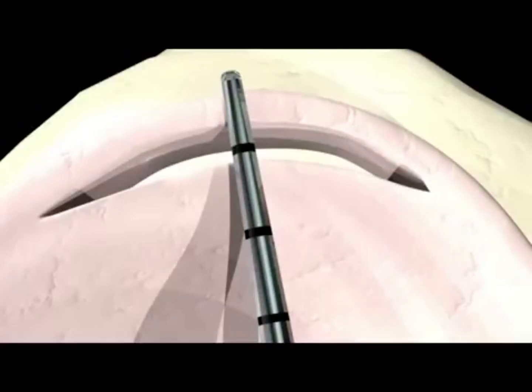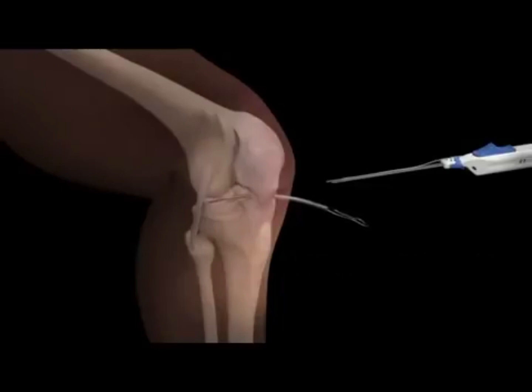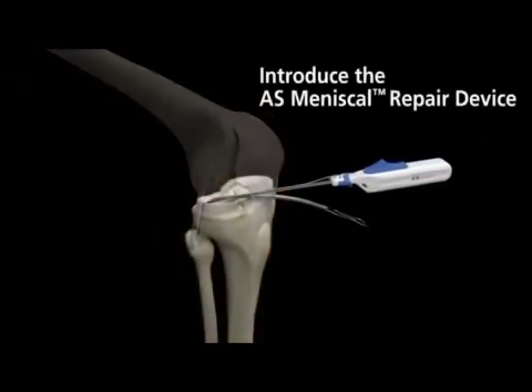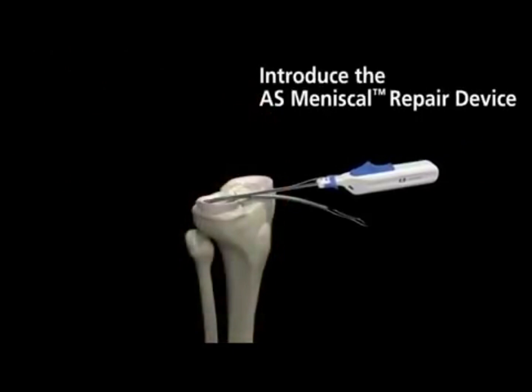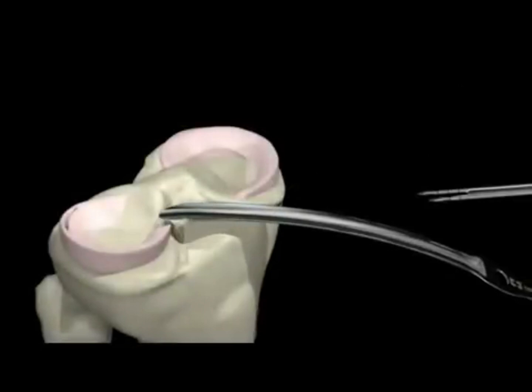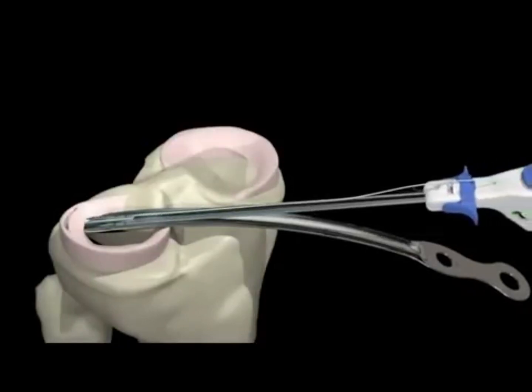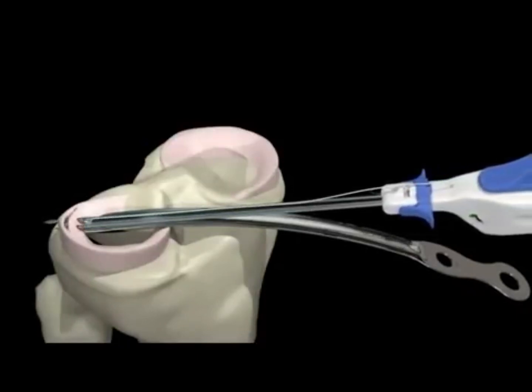Special care should be taken to avoid over-penetration when repairing posterior horn tears of the lateral meniscus. Introduce the AS meniscal inserter into the joint space through the incision portal until it reaches the joint space. The AS meniscal repair device is then introduced with the help of the inserter. The inserter will guide the AS meniscal repair device into the joint space and help avoid capturing surrounding tissue. Sliding the needles along the inserter helps reduce tissue impingement during insertion.